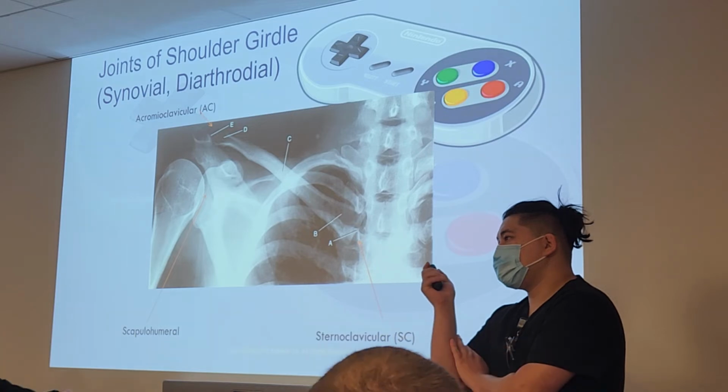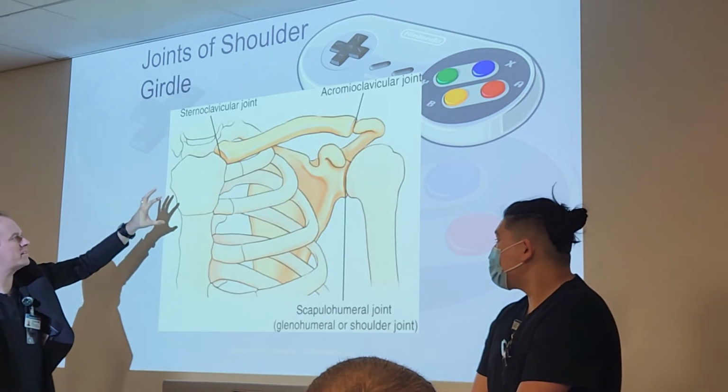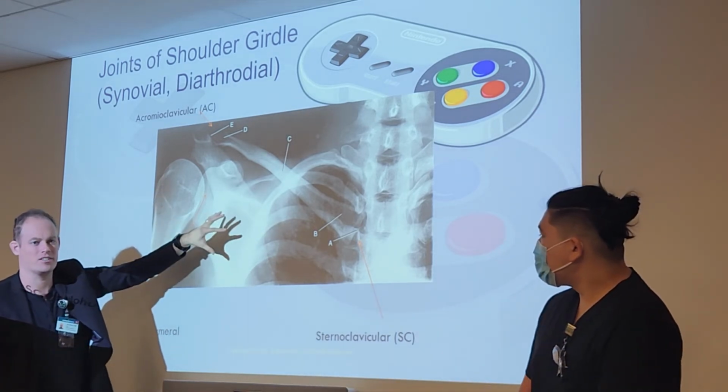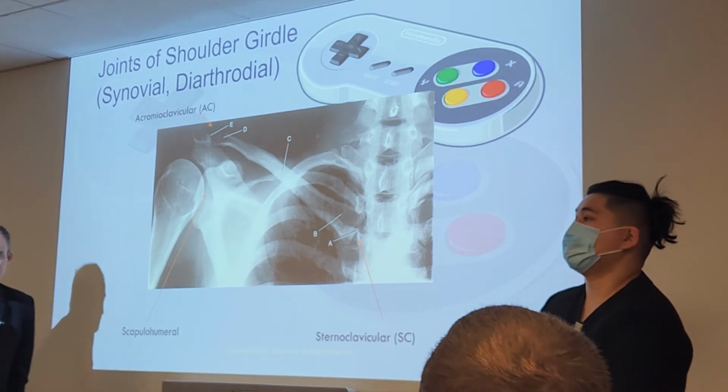What it would do is it becomes dislodged. Go back to that other picture. It would become dislodged and shift forward, like in front of the scapula. Yeah, that can happen.